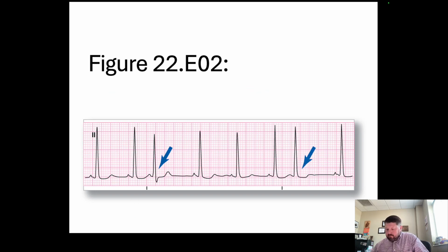So this is sinus rhythm with a PJC. This next figure shows a sinus rhythm with some ST segment abnormalities, which could be due to the digitalis effect like we talked about with atrial arrhythmias, the ladle-like or scooped out appearance of the complexes. You've got two premature complexes where the blue arrow is pointing, and they're slightly different in morphology. The first PJC has some aberrancy. The height is slightly shorter, but so is the fifth complex. The terminal S wave in the QRS complex of the third complex may actually be a buried inverted P wave. The morphology of the second PJC is exactly like the normal ones.